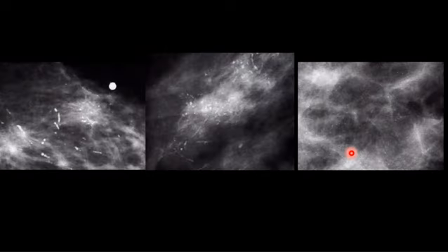Again, here we have a case of DCIS, ductal carcinoma in situ. The MLO view shows a mixture of high and low density linear and round calcifications. You can see the density is different, the shapes are different, and we said suspicious calcifications are of variable density, variable shape. If it is of different shape, different density, unusual distribution, be careful. That's a suspicious lesion. You can see clefts in some of them. You can see this is cleft-like linear calcification. I think it's obvious here, right? You can see the clefting.